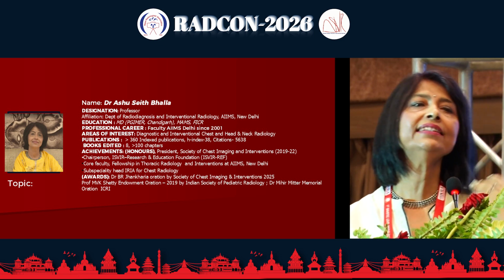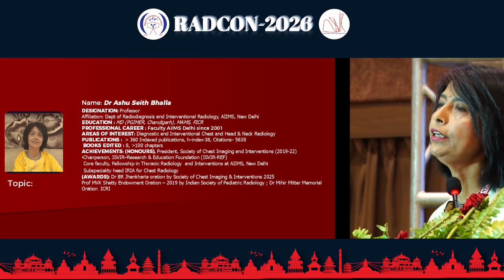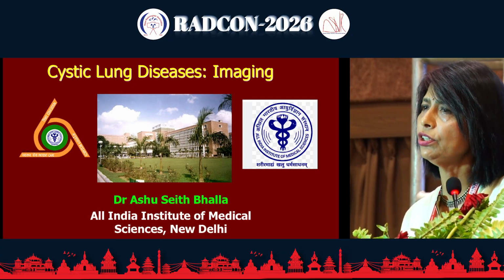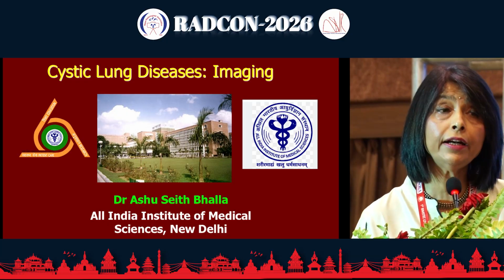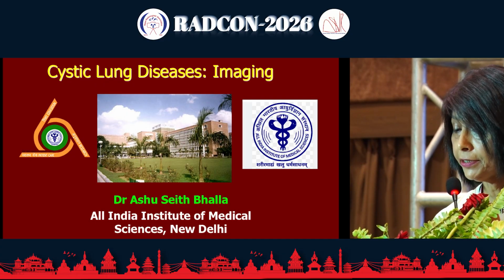Cystic lung disease. As he told you, terminologies keep changing, whether to call it cystic lung disease or cystic ILDs. And as we go through this journey, you're going to discover that half of them are not ILDs at all. Most of them are tumors. Having said that, let's understand the individual disease processes, their etiology, their treatments, and essentially what you report and how it matters.